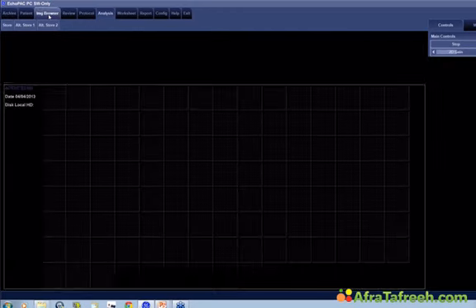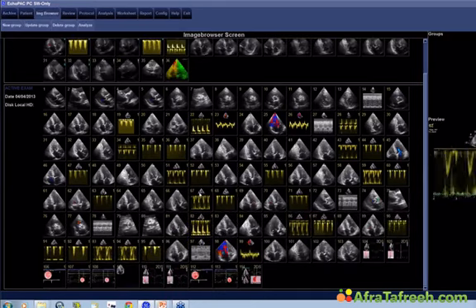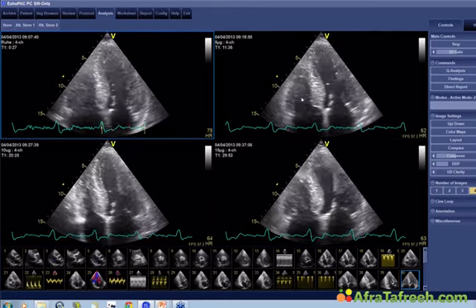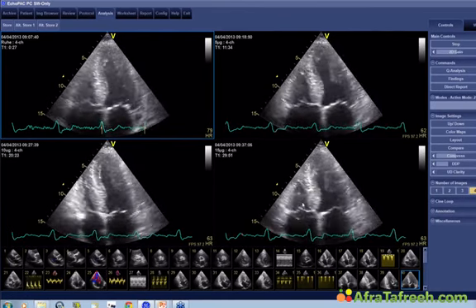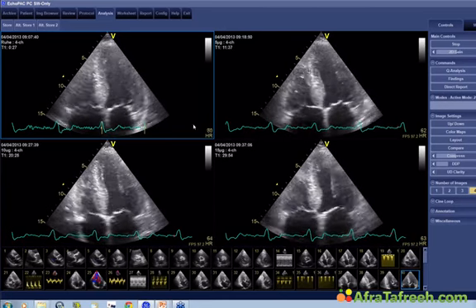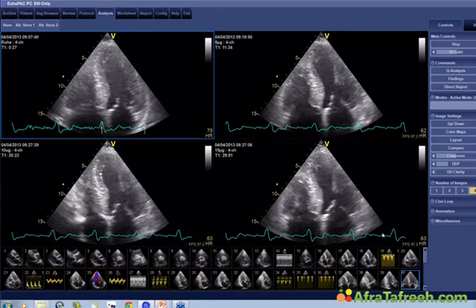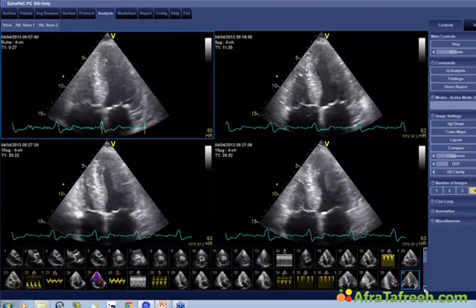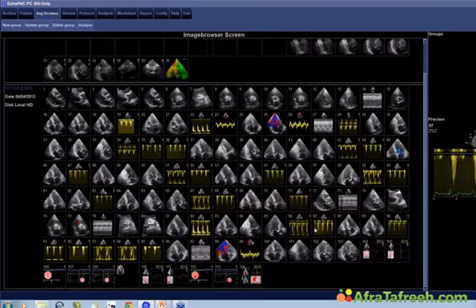Let me go now to the study again, and I will compare the different 4-chamber views so that you can see how much ejection fraction has actually changed in this patient. Okay, let me just find the right loops. Okay, so these are the four chamber views. This is rest, this is low dose, higher dose, and maximal dose. If you compare the two, you see that there is a contractile reserve. Ejection fraction, beyond doubt, is better. And the question now is, how does that influence the gradients?